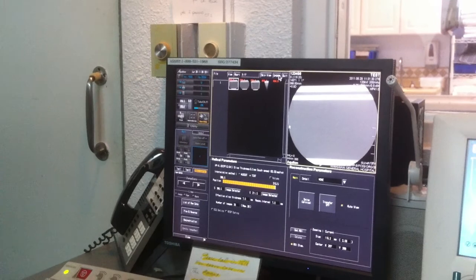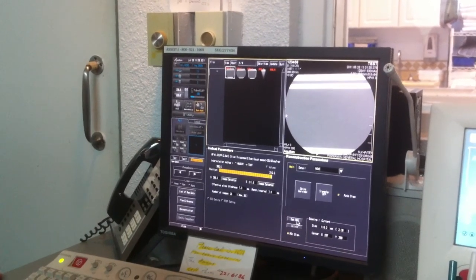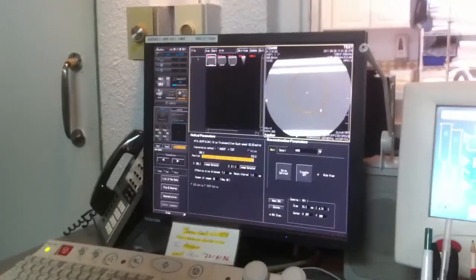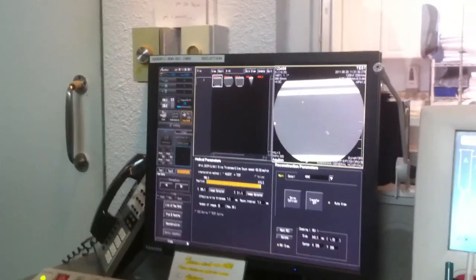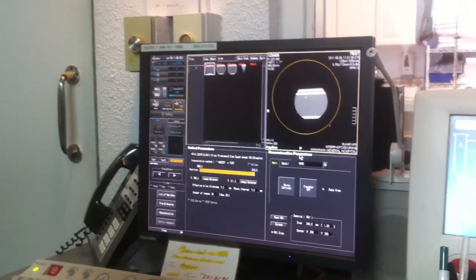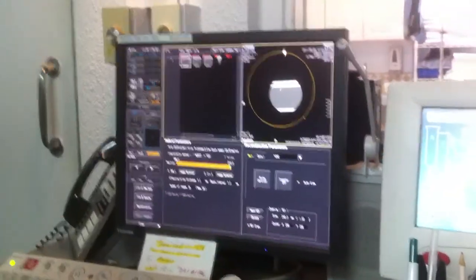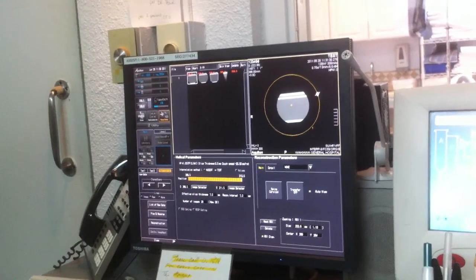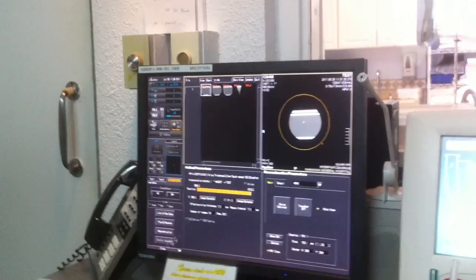There's my images right there. So now I can go ahead and hit next or start our first ROI and do what I need to do with it. So if it needed to be, okay, you shrink the image so you can widen it out. Right. I wanted to recenter. Now I can reconstruct that.